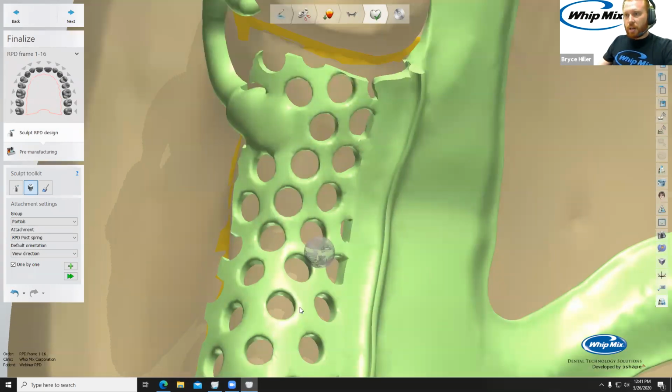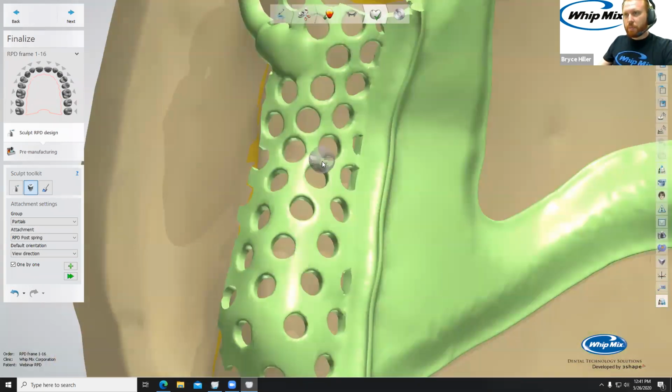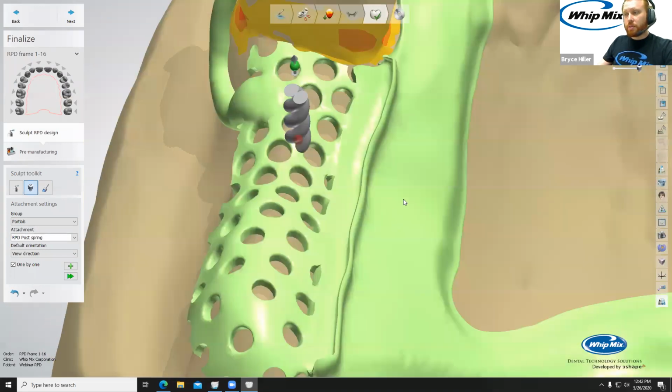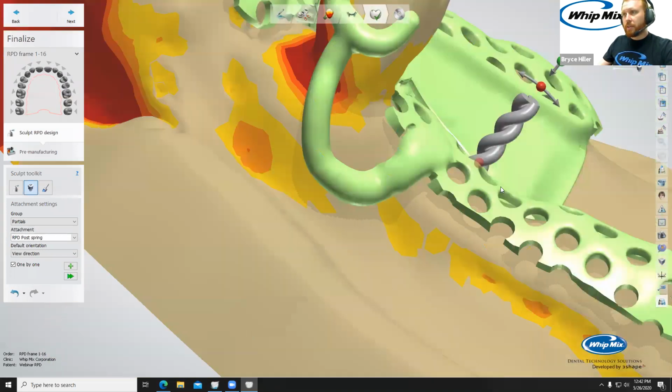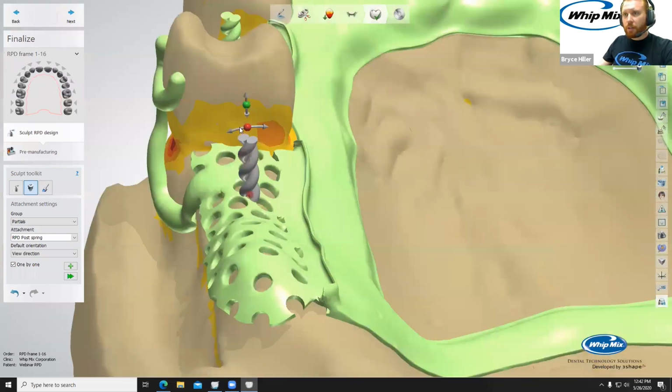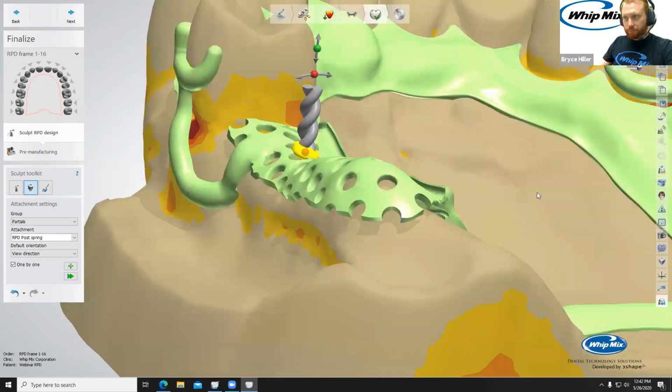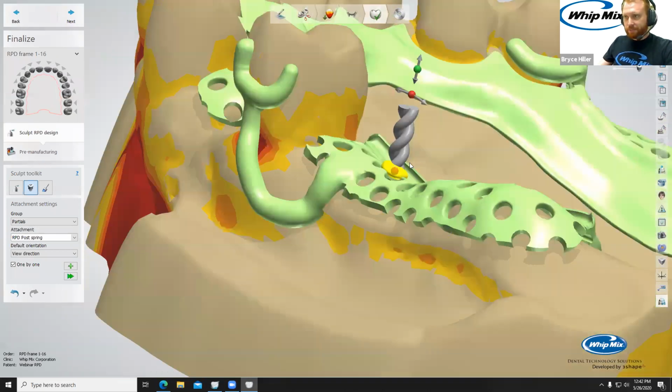So let's go back here. Let's say we want to place one like, I don't know, right here. I'm simply going to click to throw it down there. And then we can use these control points to morph it. Now, the other cool thing you can do, if you right click on it, we can add a base, which is kind of nice. Give it a nice solid base.